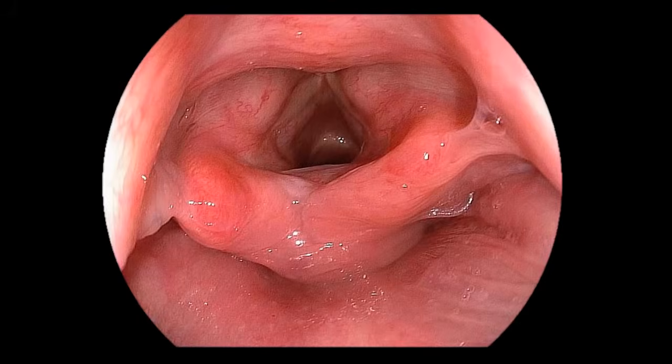Now, this is an image of the border of the laryngeal inlet as seen by a laryngoscope. And yeah, it's possible that you don't recognize anything on these images, so let's help you. I'm showing you this because it will help you understand what you see in your images. Over here, we see the laryngeal surface of the epiglottis, so basically the back surface of the epiglottis.